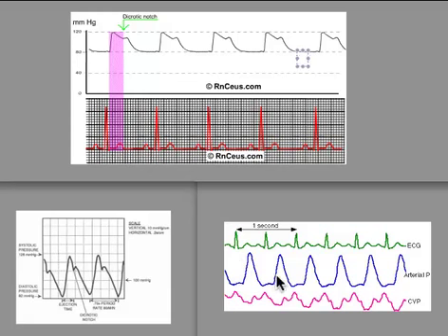You'll notice that the A-line tracing actually happens a little bit before the CVP tracing, but this is a short intro to reading an A-line tracing.